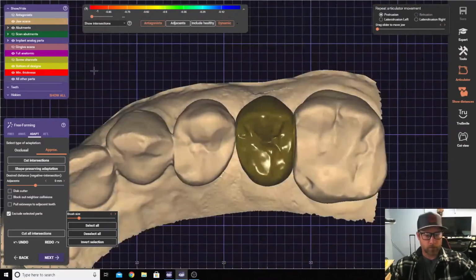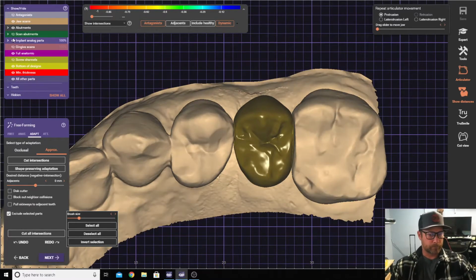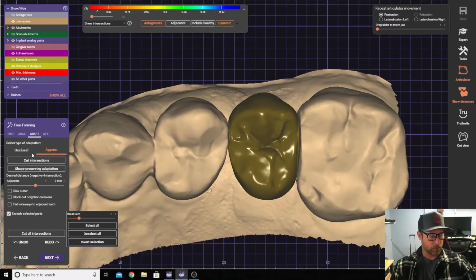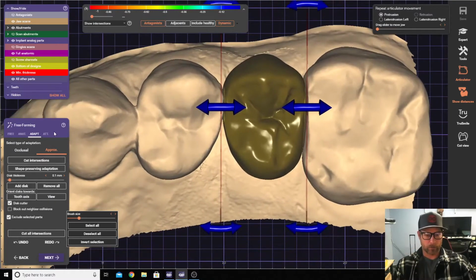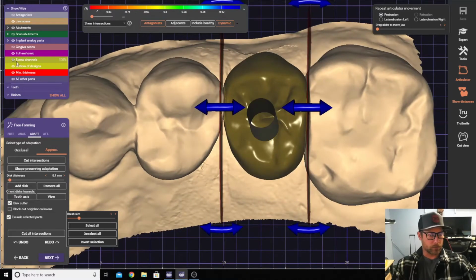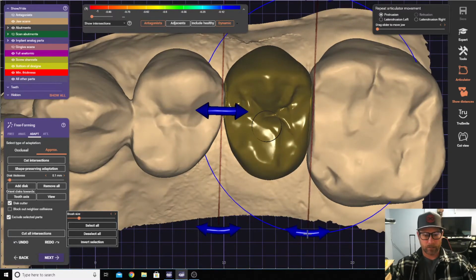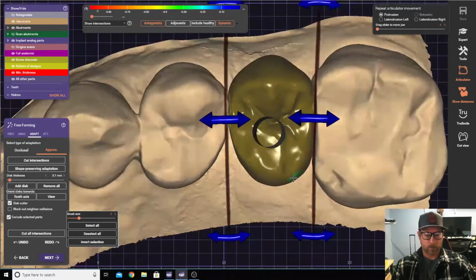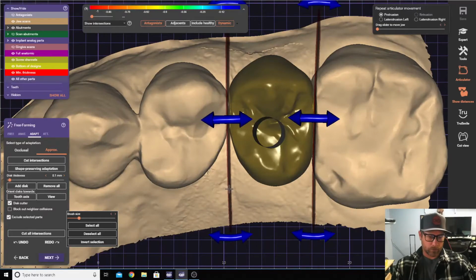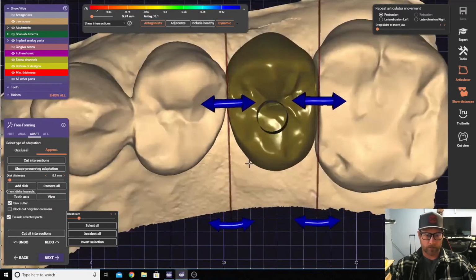Lastly, and probably most importantly, the contact areas on screw retains are tough. They can only go in one direction, so using the disc cutter tool is incredibly important. You don't want to change the angle of how the discs are right now. You can move them side to side, but don't change distal lingual or distal mesial, sorry. If you do that, then the insertion direction won't fit.